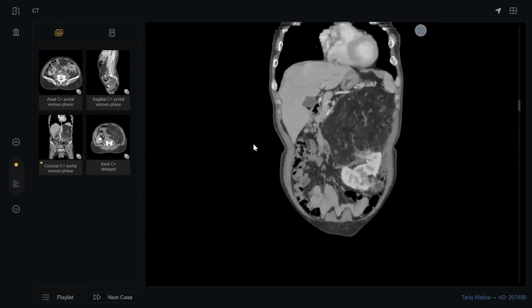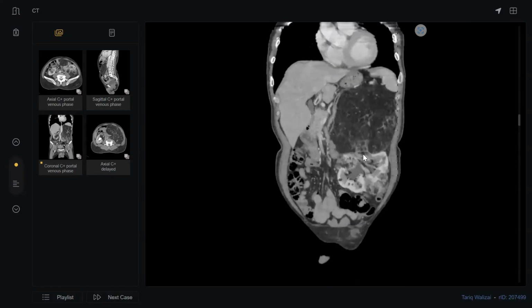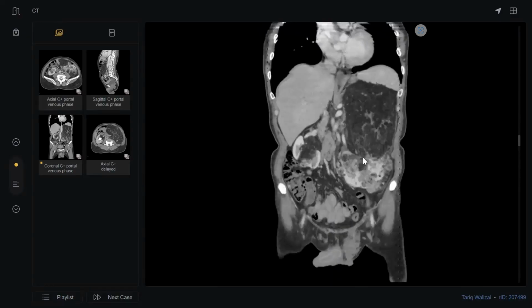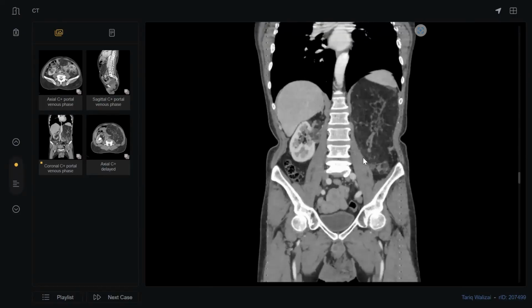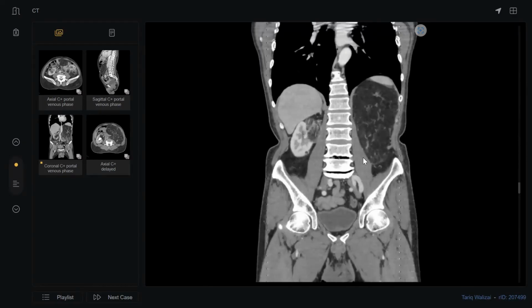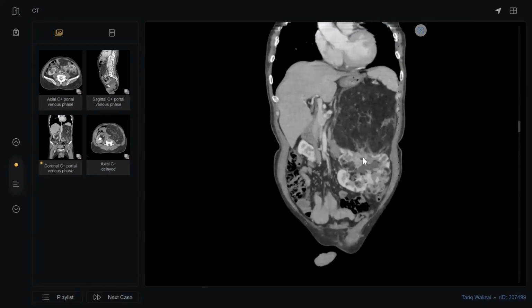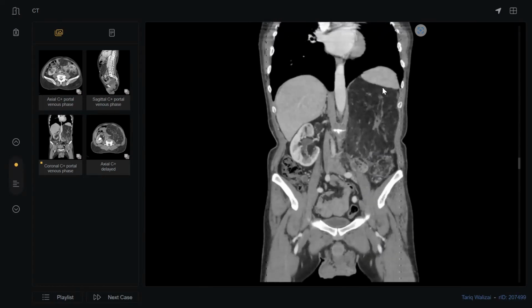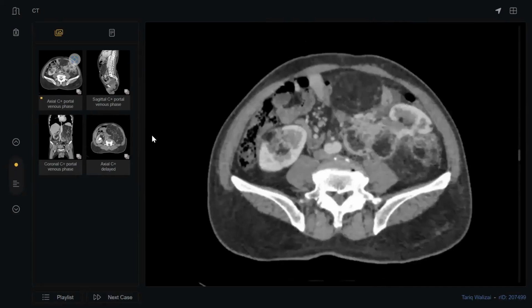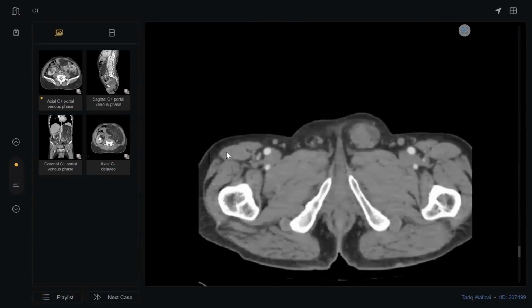This case shows a large left angiomyolipoma. But if we look at the rest of both kidneys, there are multiple bilateral angiomyolipomas. So we are talking about almost certainly tuberous sclerosis. Till here, there are bilateral multiple lesions. I don't know why this was left until this age. The patient is 50 years old. But however, that is the case.